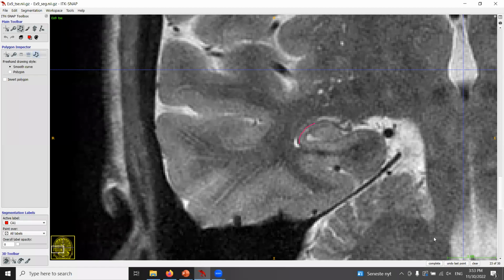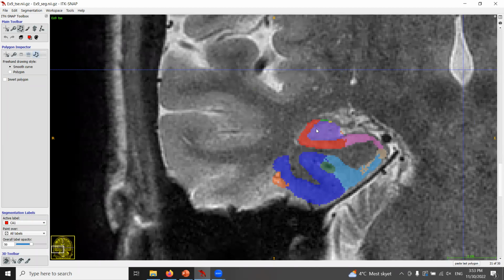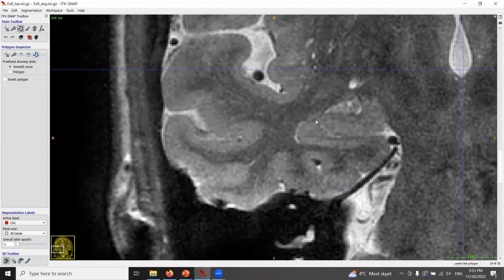That could also happen, but yeah, we're looking for this darker line. So I see it's a small error on 2 slices, and then if I follow the darker line here, maybe a 3rd slice, and then here it's actually fine, I would say. I didn't draw that very cleanly. All right, let me do that again. Yeah, so I see a very small error, maybe on 3 slices. So here I wouldn't edit, I wouldn't do anything. I would just include this case.